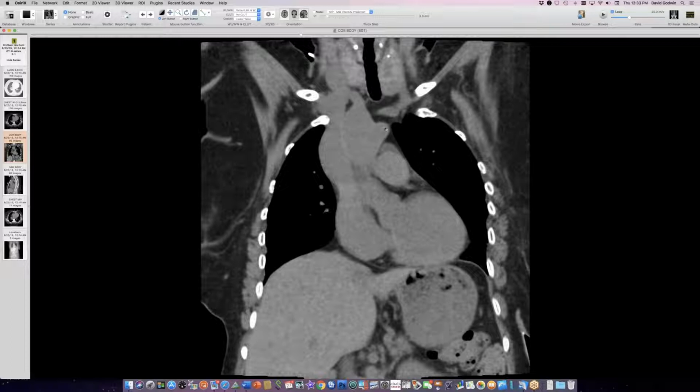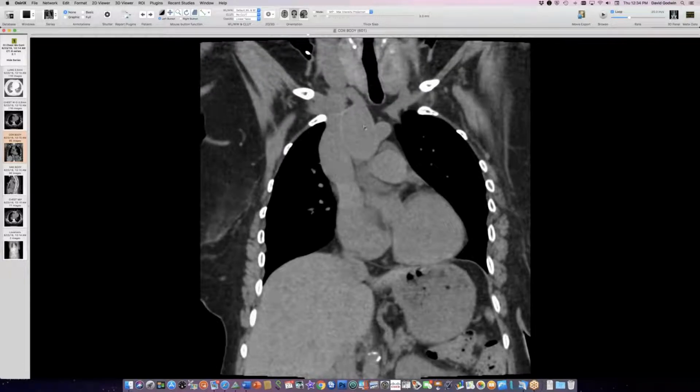But if this is really a right aortic arch that's not part of a double arch, then you don't get this V-shaped origin. You get the left moiety coming off the top of the right aortic arch, not off the side like this and forming a V. So this is V for victory here. This tells you, I think, pretty reliably that this is a double aortic arch.